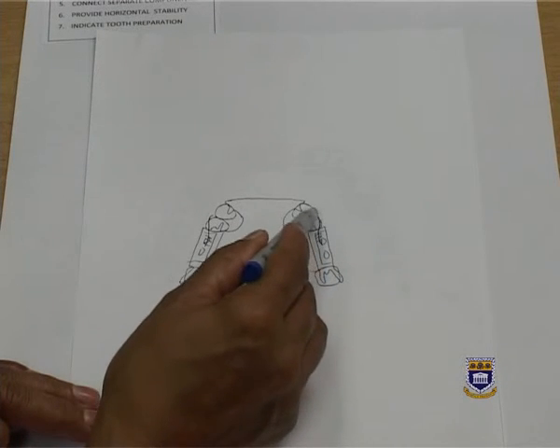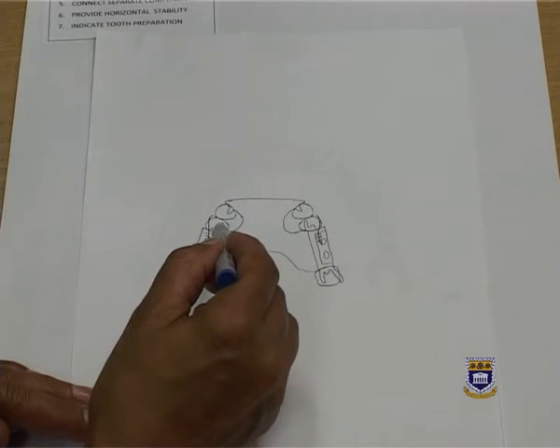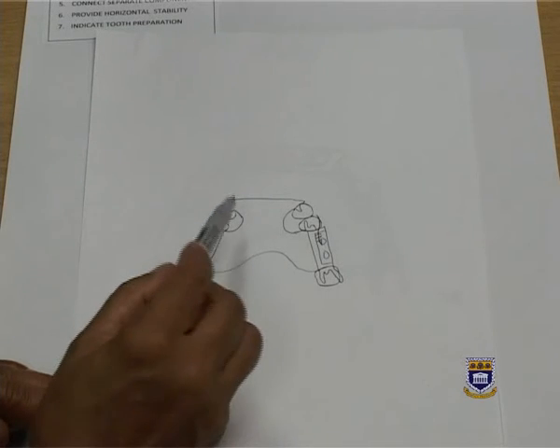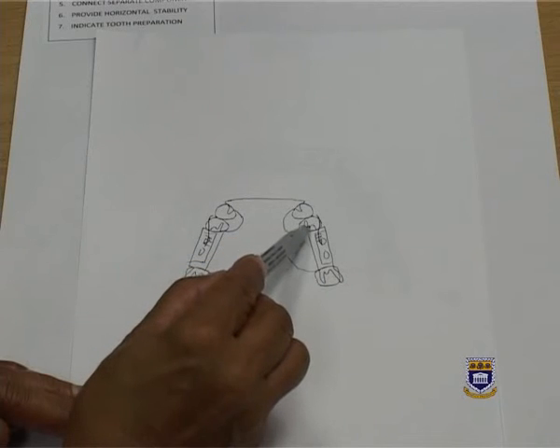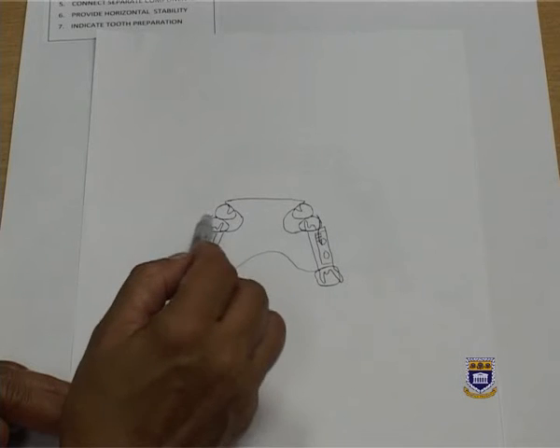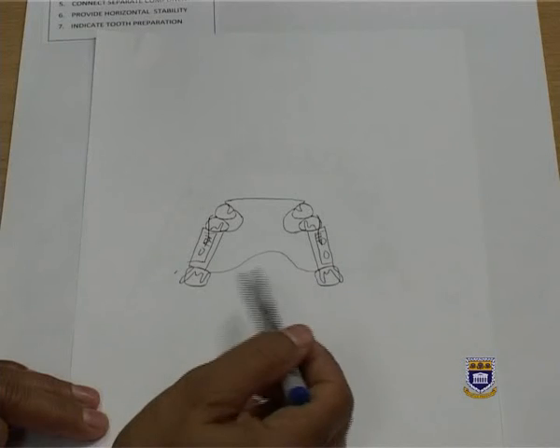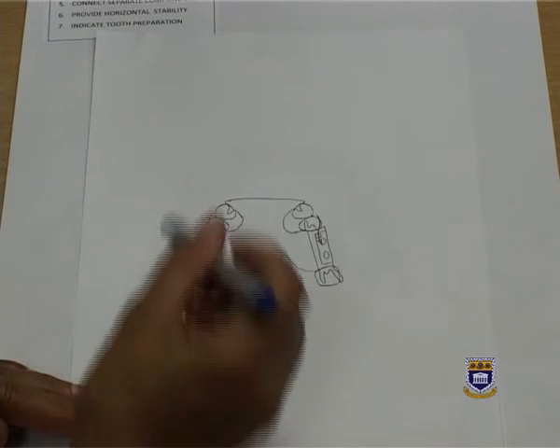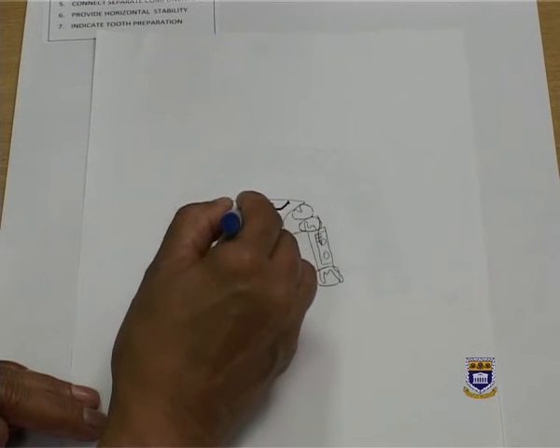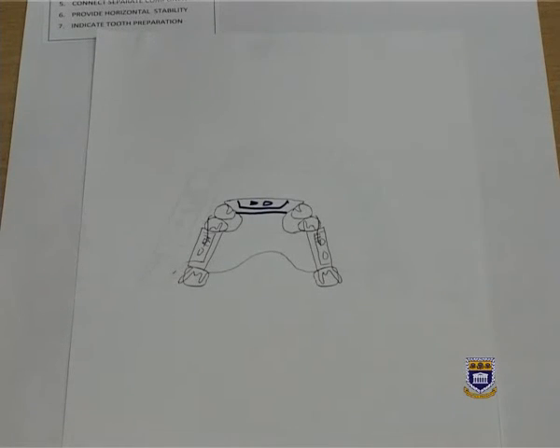I have asked the technician to solder on a C clasp, which is stainless steel, and I have provided reciprocation with my chrome cobalt reciprocating arms. In this case, I also have 1, 2, 3, 4, 5, 6 rests. I've got my 2 soldered C clasps and 2 circumferential clasps on my metal partial denture. And here I have to indicate my acrylic finish line as well as the retention holes.